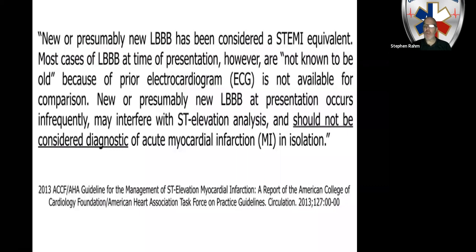So then the question comes, if you have a patient with a left bundle branch block, how could you identify an underlying STEMI? I want to preface the rest of this conversation by saying that in our regional heart alert criteria, the Sgarbossa criteria are not factored in, which simply means that it's not expected that we would look at a left bundle branch block and try to determine what's normal versus what's abnormal. We just really need to know what's normal with left bundle branch block, and I think that alone would help reduce some of the number of overcalls that we're having.